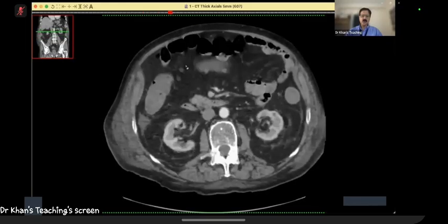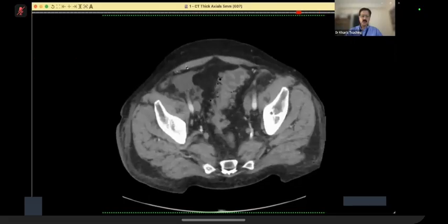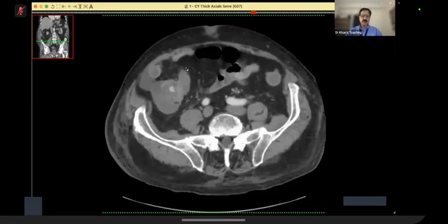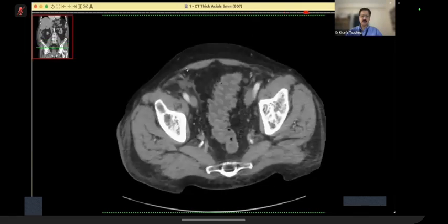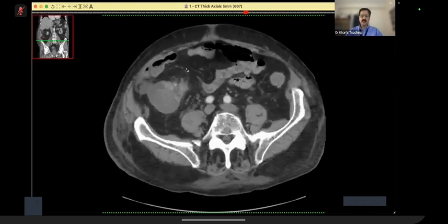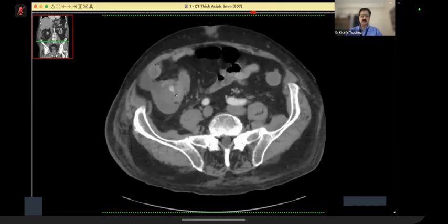Venous phase, to do venous phase or not, some people do it, some people don't do it. You are right that in venous phase, at times the diagnosis becomes more obvious because contrast can be seen changing position. But non-enhanced phase is the critical phase. That is the critical phase. So in the exam, you have to immediately ask for non-enhanced phase. Otherwise, you did well. Now, just to go through the case, there was this arterial blush, which needs confirmation.